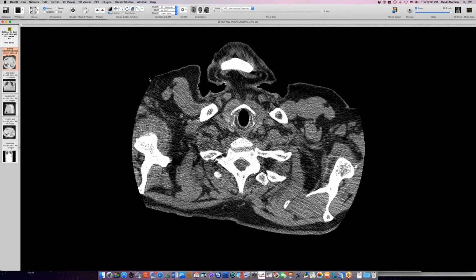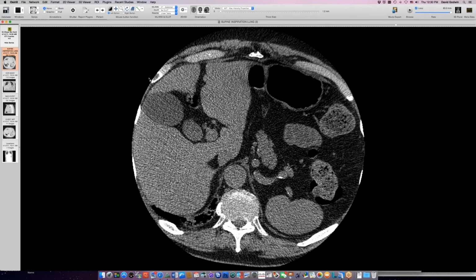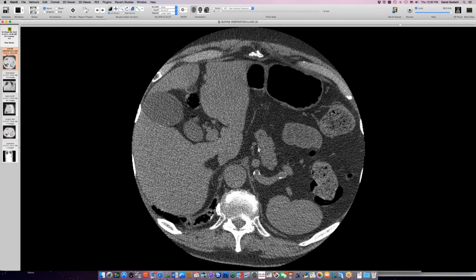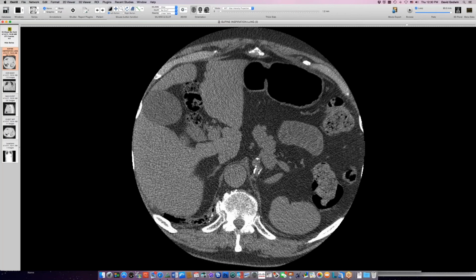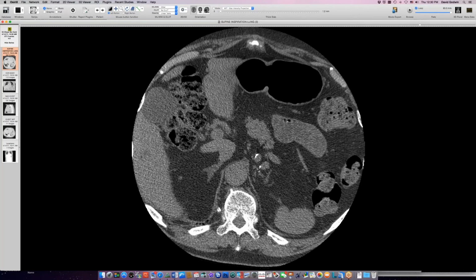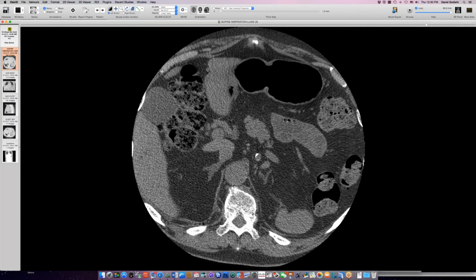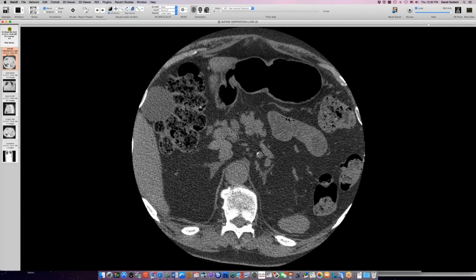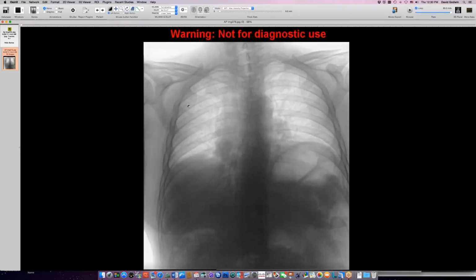But then when we look at the cross sections, we see that both of the crura are fairly thin, not atrophied completely, and there's still a little bit of crus muscle here, but pretty thin. So you kind of wonder, is this really a paralysis with a funny shape to it? So we did fluoroscopy on him, and I want to emphasize the helpfulness of lateral fluoroscopy.